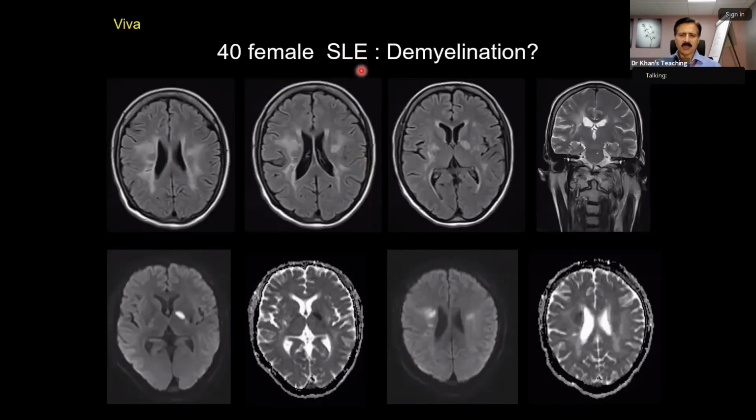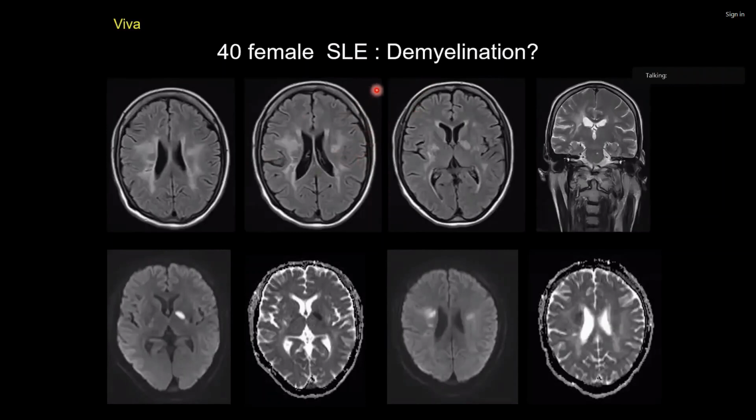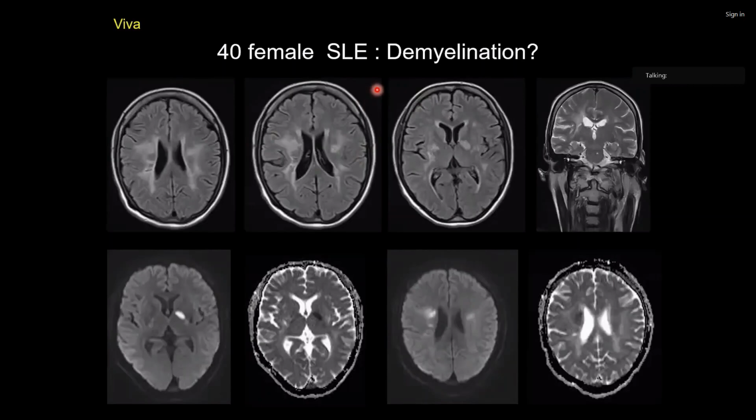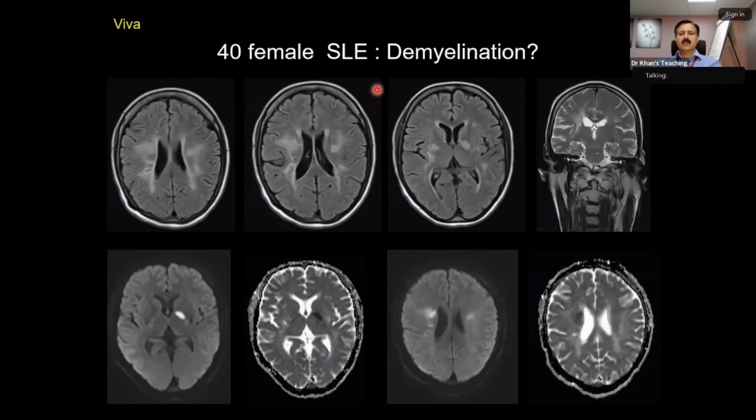So you did a scan, and what are the findings? Is it MS, or can you explain it on some other grounds? I don't think it's typical configuration or morphology with regards to the hyperintense signal, although it is predominantly periventricular. There's also basal ganglia involvement, and I wonder in the context of SLE whether this is a vasculitic picture, so more of a deep, small vessel disease pathology, or vasculitis.